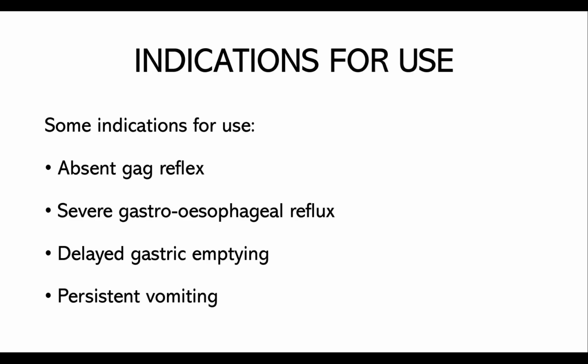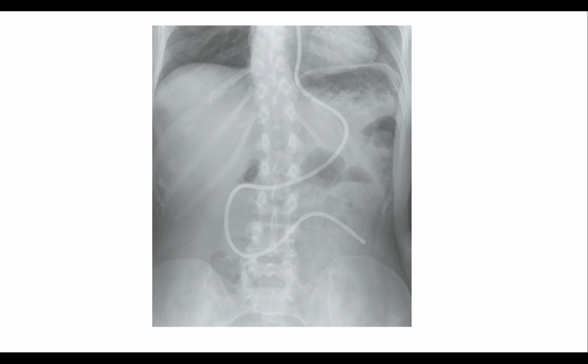Some indications for use: absent gag reflex, severe gastroesophageal reflux, delayed gastric emptying, persistent vomiting. Correct position of an NJ tube.